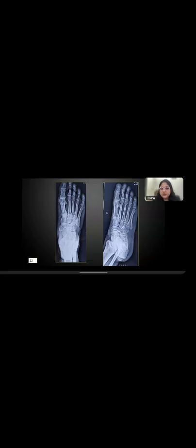Yeah, 22, melorheostosis. So one answer I've already got. Where is the melorheostosis? You see the first metatarsal, the medial cortex is very well seen. This is what melorheostosis looks like. It is called dripping candle wax appearance. So sclerosis along the cortex of the bone looking like dripping candle wax. Type 2 os naviculare, yes, of course, that is also present.